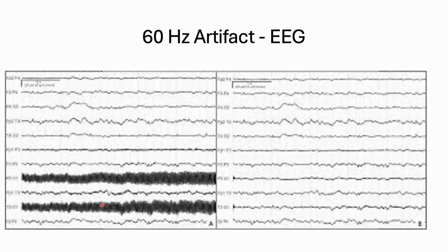All right, that's a lot of artifact stuff. The more you look at it and the more you try and figure it out, the better. But the key is, if you see artifact, you document it. If you know what it is, or you think you know what it is, try and fix it. Because cleaner studies just make for so much better studies, and you'll feel great if you run clean studies, because they're just really nice to look at.